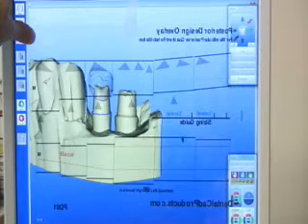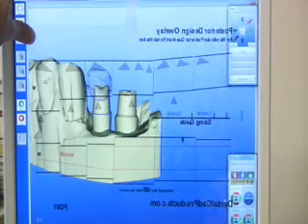Also, we're able to gather how the inclination of the two should be. That helps us set up the curve of Spee. Since this is an implant case, it's not exactly in the right position, so we do have to skew a few things to get it to work the way we want it to be.